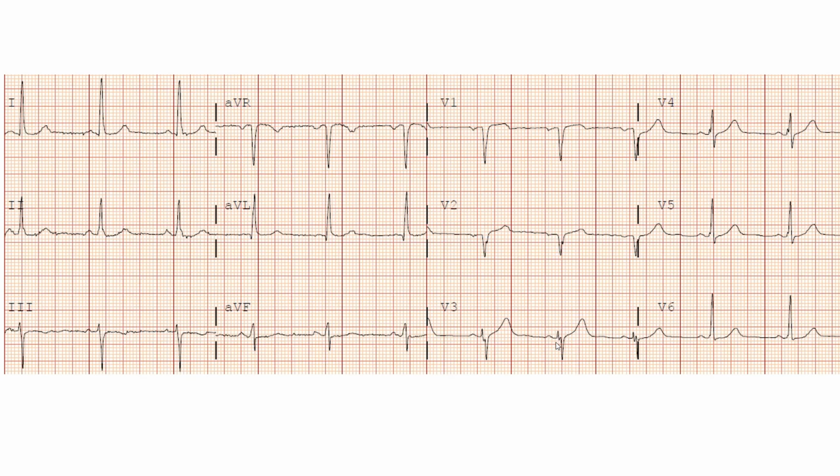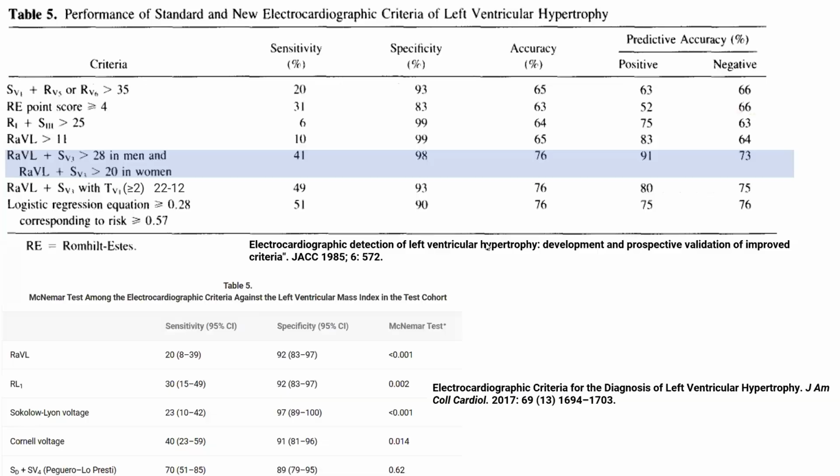He has poor R wave progression. He has a QS in V1, V2, and the R in V3 is 1.5 millimeters. But he has quite a big R, bigger than S in V4, V5, really big R waves in V5, V6, especially more than one big box, much more here. And really R wave bigger than 4 millimeters in lead 1, way bigger than 4 millimeters, actually LVH in lead 1 and in AVL. So this is not an anterior MI, I can tell you.